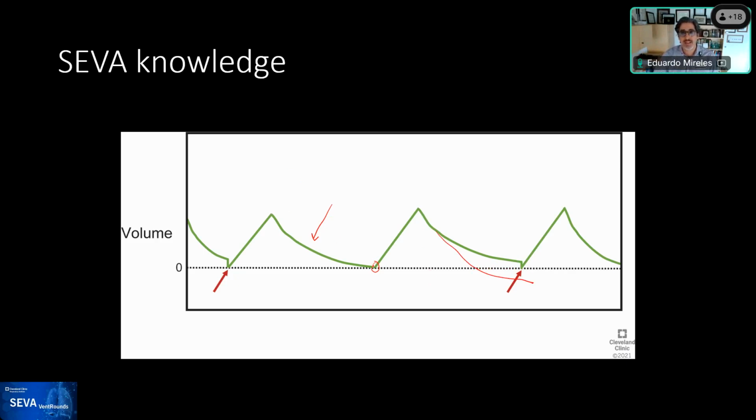And as it resets, boom, then you exhale double the amount. So really just be aware of these little details. It says PC due to PEEP, pressure control due to PEEP or pressure feedback sensor. I presume that he is referring to why the pressure is controlled during exhalation, and that's because you set the PEEP. And when you set the PEEP, you're controlling pressure. So the machine is going to try to keep the PEEP at that value. Is that correct, Rob? That's correct.